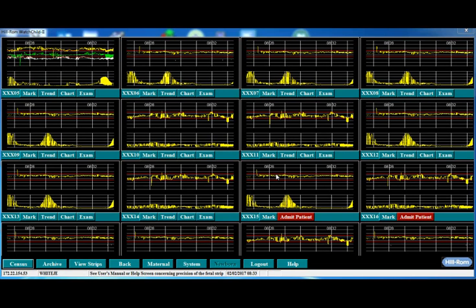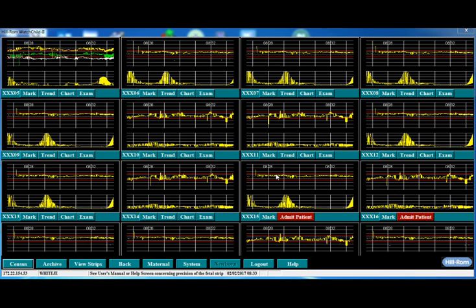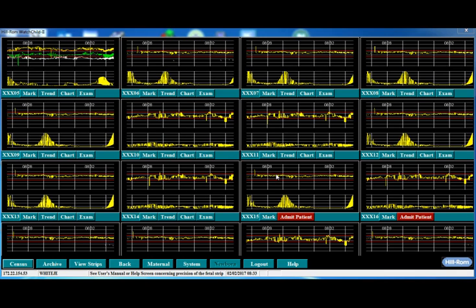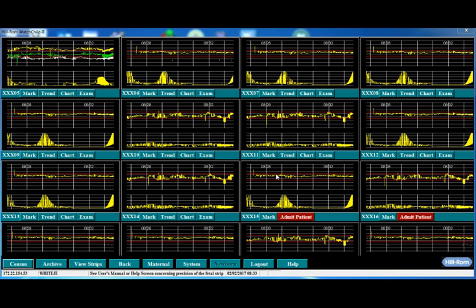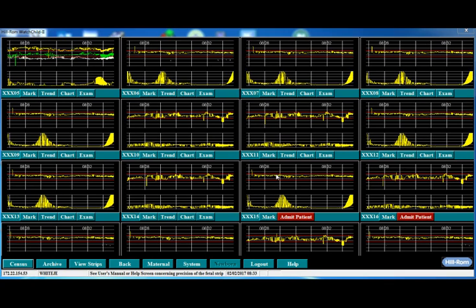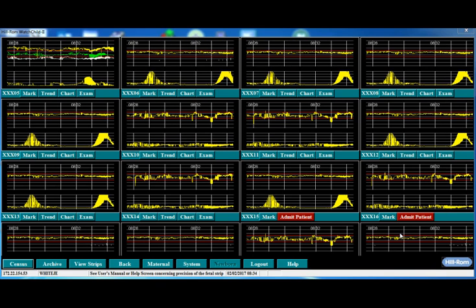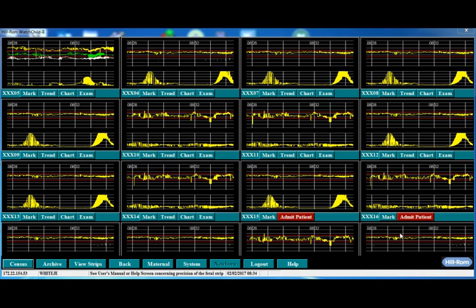The fixed monitors will populate a single surveillance screen for the patient located in that room, and the workstation on wheels will populate multiple surveillance screens, such as you can see on the screen now. The office workstations will populate multiple beds on the surveillance screen, and the team station will populate only the census board. When there are multiple surveillance beds on the screen, select the strip you would like to annotate on and it will become full screen.